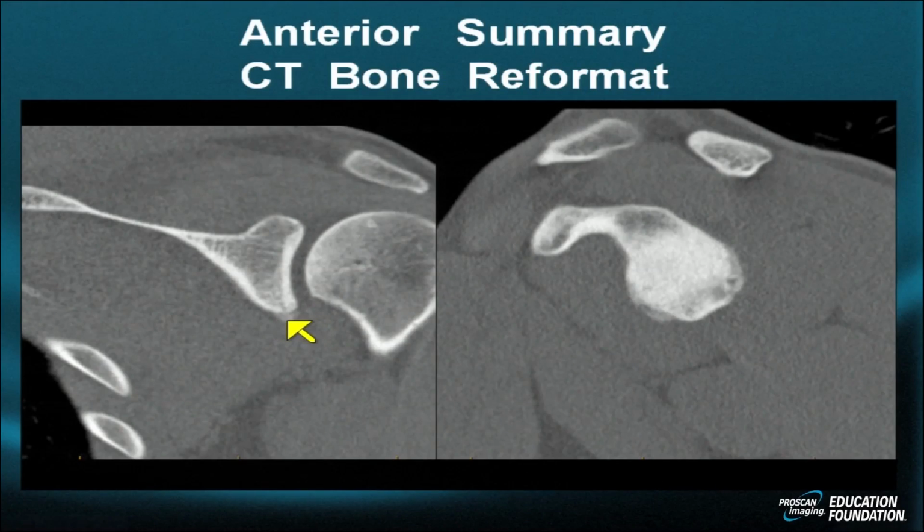One of the first things you want to do, whether you're anterior or posterior, is assess whether a piece of bone is involved. If you're unsure, then resort to the reliable thin section CT with reformatting that shows in this case a tiny inferior and anterior bony and periosteal insult that otherwise was not appreciable on MRI.